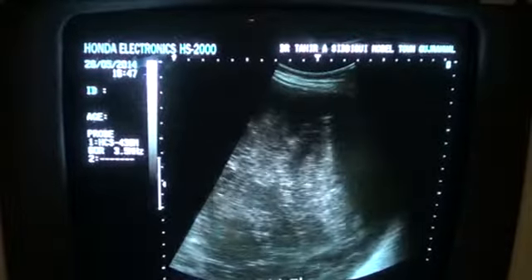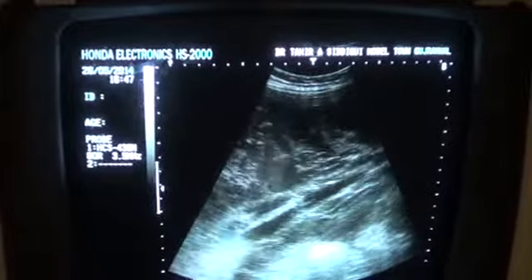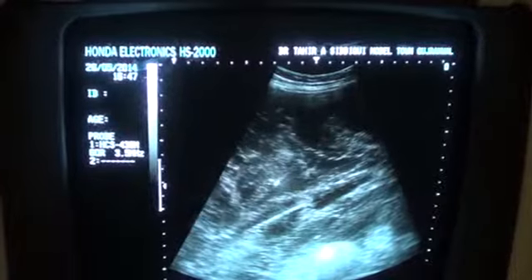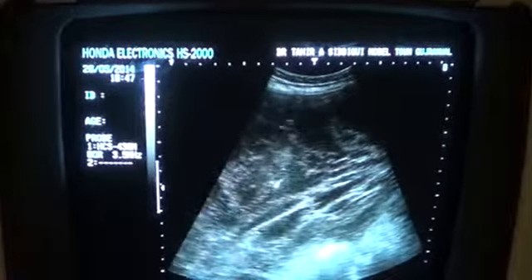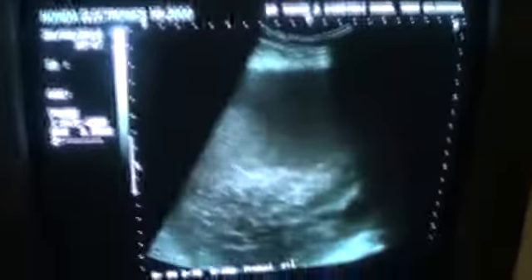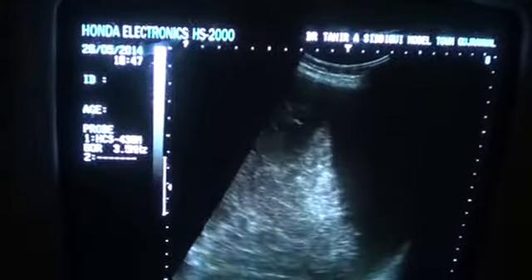All the same picture that I have shown you and am showing you repeatedly. Thick bands of linear structures within this fluid, intermingling with each other. This is the fluid part.